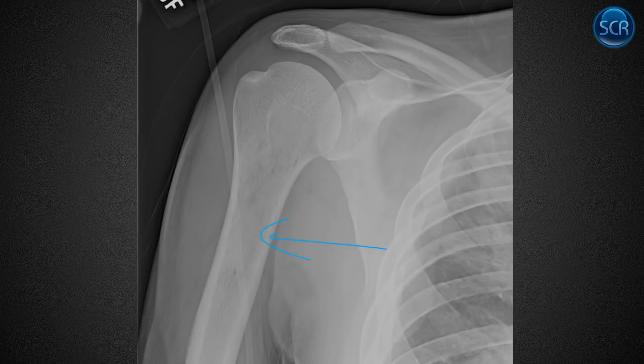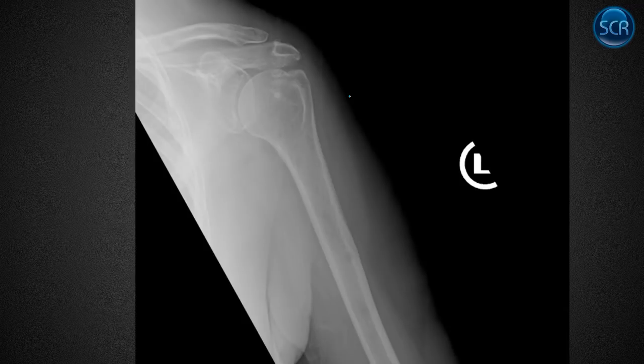There's something else I'm going to mention on this one. Oh yeah, so they have some lung stuff over here too. You can see they've got some kind of infiltrative lung findings. Looks like consolidation. This is, I think, lymphangitic spread. This is a typical appearance. This isn't a Hill-Sachs, right? This is normal transition to the greater tuberosity. AC joint looks normal.